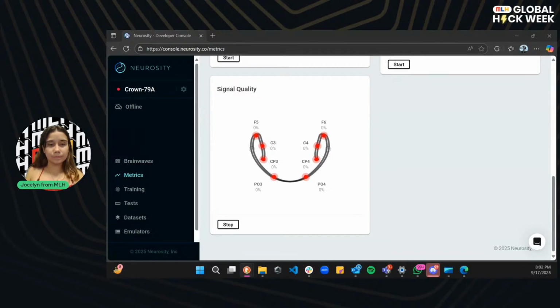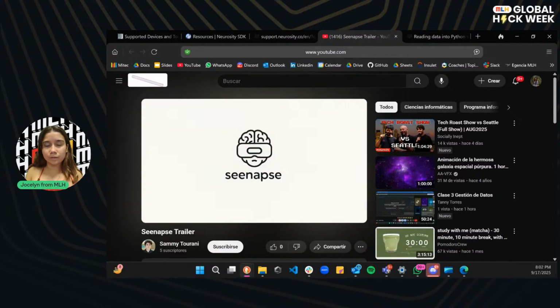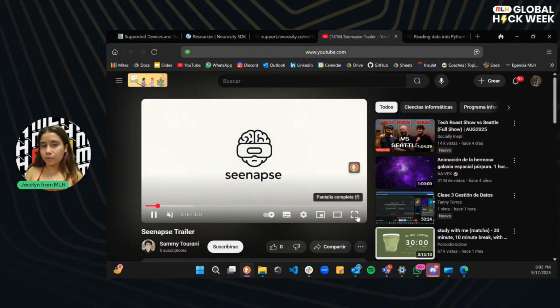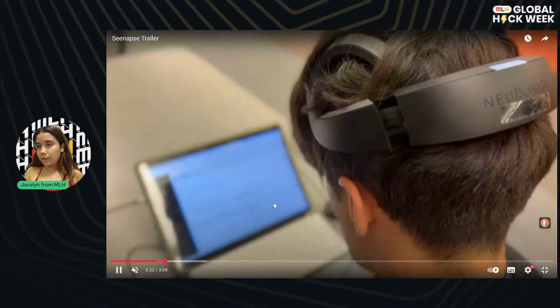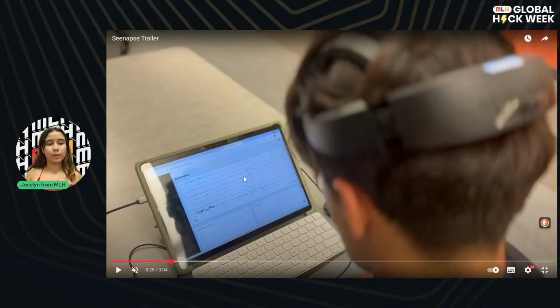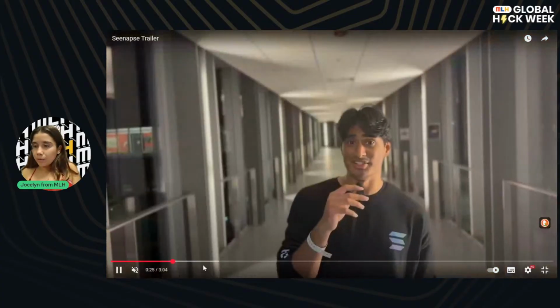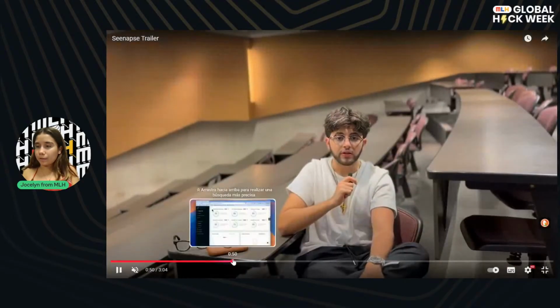Let's see. Watch on YouTube. Okay, let me open it up over here. So you should be able to see the video in here. Let me move it to where we... So in this case, we're using the Neurosity Crown, and you're able to see the brain waves in there, which is really cool. Let me see if there's another demo. Oh, here's another one of how it looks.